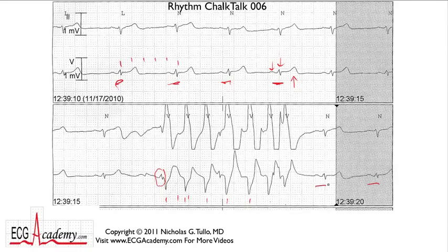But the first thing that bothers me is if this is a QRS complex, and it looks like it, because it looks a lot like this one, and it occurs on time, how can a PVC start so soon after the QRS? In fact, it almost seems to start with the QRS complex, right? On the top lead here, that doesn't make sense. And then if you look through this tracing, you see something. In fact, you see this signal that looks just like this. So you start to wonder, is this real or not?